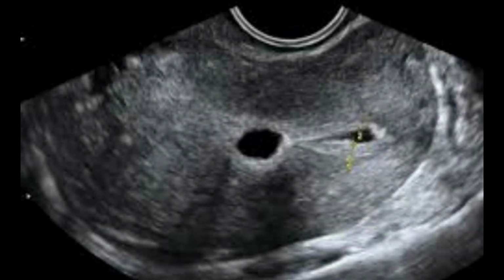This is another slide, a transvaginal scan, and on this transvaginal scan the uterus is clearly visible. Within the uterine cavity again you can appreciate a small amount of fluid. It would also be considered as streaks of fluid. So it is a mild degree of pelvic inflammatory disease. It's a mild stage of endometritis. However, this round shape may be mimicking a pseudo gestational sac. You have to be very careful while you are reporting.